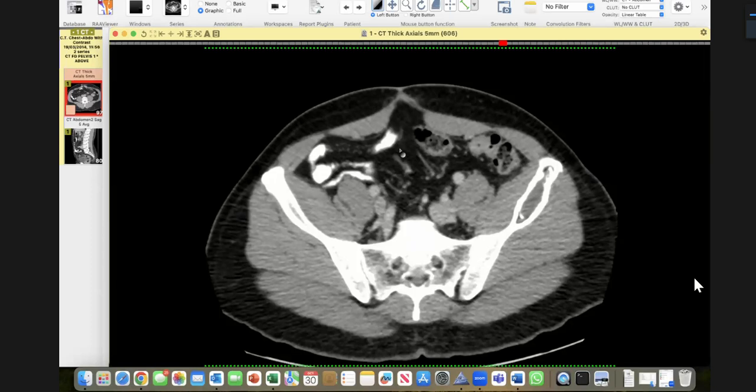Is this an age group for simple bone cyst? And the answer is no. So here comes your clinical reasoning. You remember those headings? Yes, sir. This is how you are going to be marked. Sir, but fibrous dysplasia also I dismissed on the basis of age in the beginning.